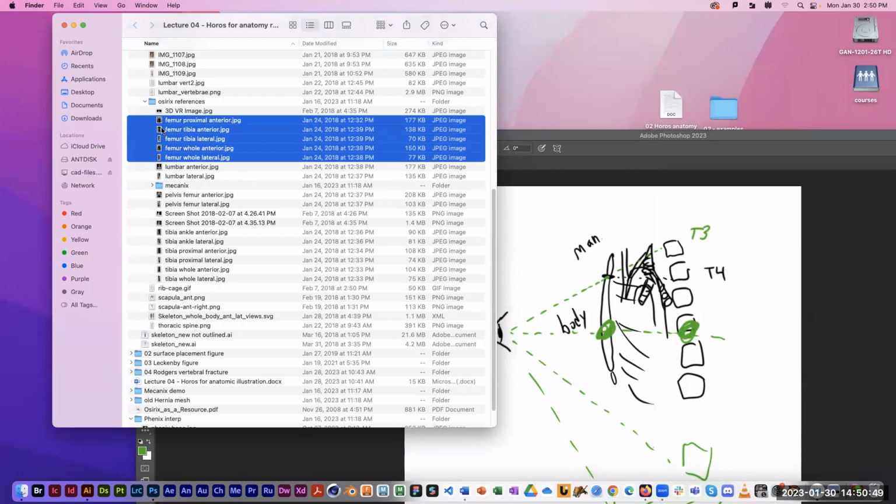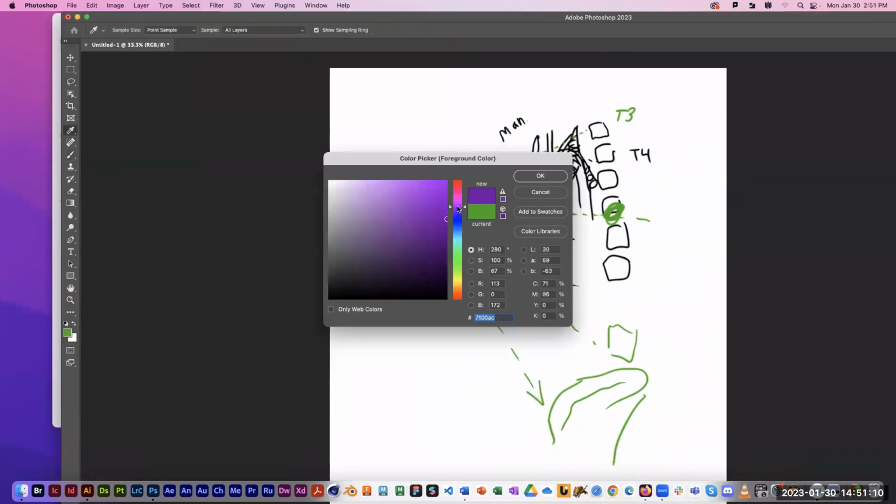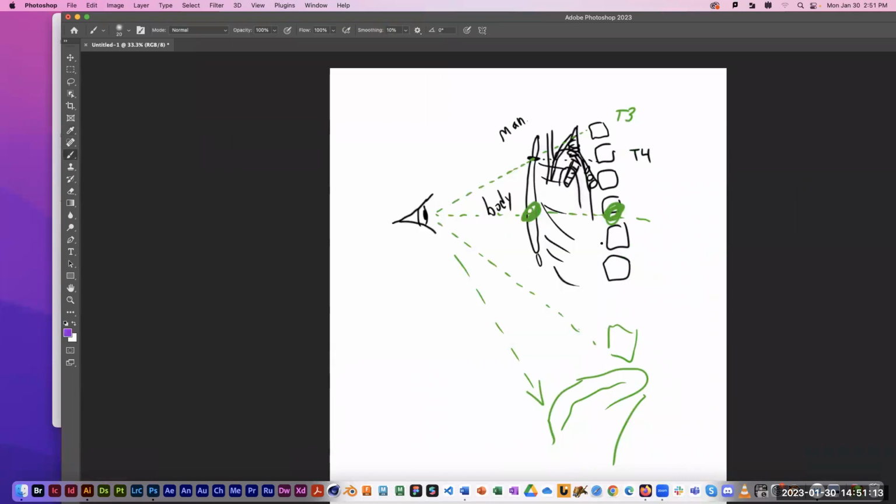But I'm also going to point out something else in Horos. In Horos, you actually have the ability to choose between a perspective view, like your eyeball or camera, or you can also choose what's called a parallel view. And in a parallel view in Horos, when you're looking at a bunch of anatomic structures, it's as if you've got a whole bunch of eyes at every level of the body that are always looking perfectly straight across.